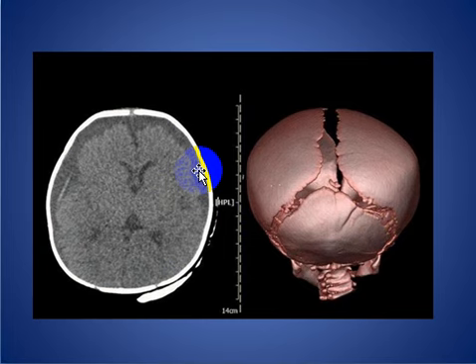We see bilateral subdural hematoma, chronic and acute on the right side, with mass effect. This possibly raises the possibility of non-accidental trauma, child abuse. Keep it in mind if you have a skull fracture at an uncommon site, and different ages of subdural hematoma.